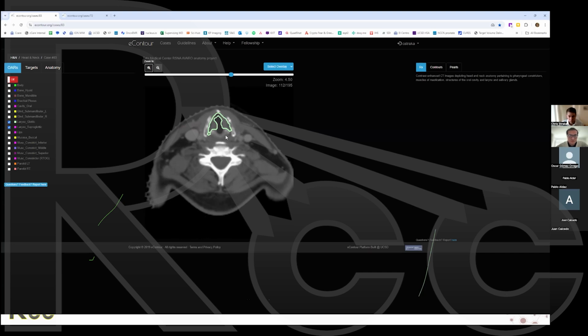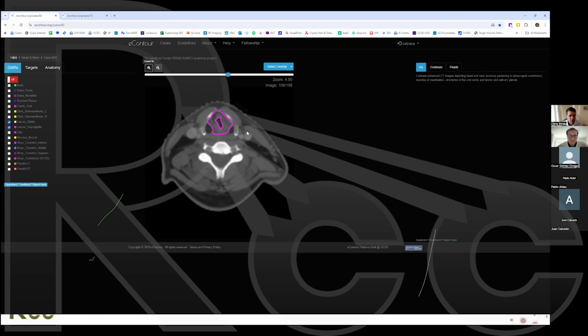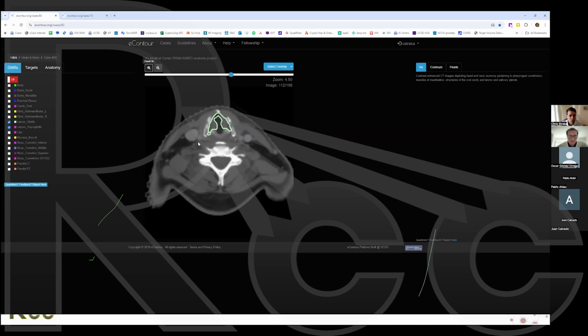But for speech quality of life, which is very important, make sure your dosimetrist is pushing on that larynx. If you're treating a standard oropharynx case, you're treating up here, you're treating the lymph nodes on both sides, you're tracking the lymph nodes down, and again, even if you're needing to include those RP lymph nodes, you should be able to get quite good larynx sparing with IMRT.